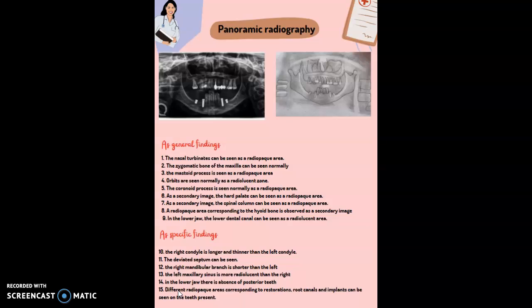13. The left maxillary sinus is more radiolucent than the right. 14. In the lower jaw there is absence of posterior teeth. And 15. Different radiopaque areas corresponding to restorations, root canals, and implants can be seen on the teeth present.